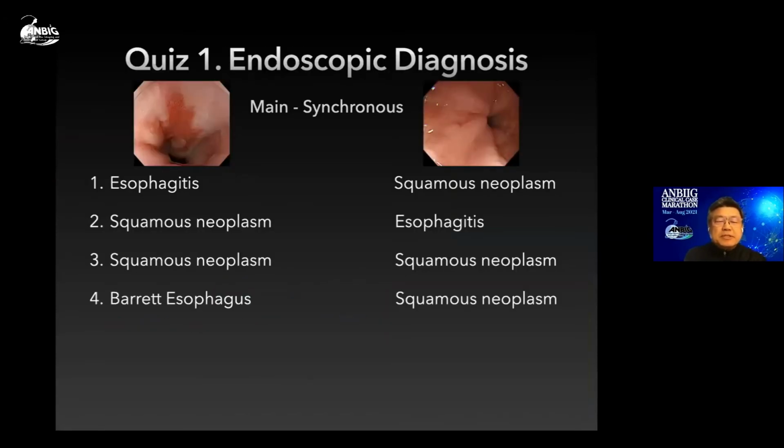So first quiz. What is the endoscopic diagnosis of this main and the synchronous lesions? What is the accurate answer? 1, 2, 3, 4.